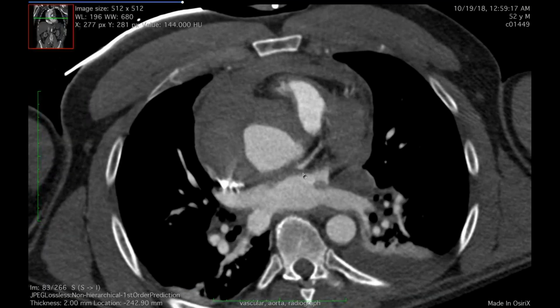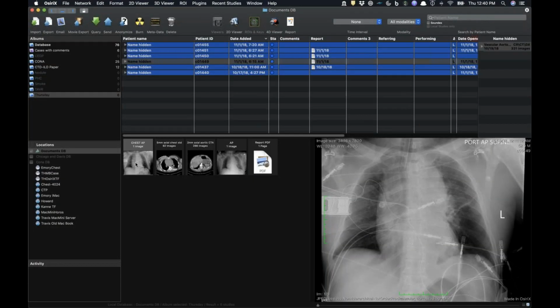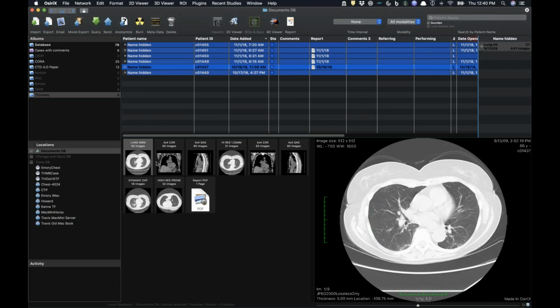They did do an ascending aortic repair, but he never got off the ventilator and unfortunately passed away. But I think it's a really good example of mediastinal hematoma and true widening of the mediastinum, not just a large patient. Because again, you lose all of your left-sided mediastinal structures and all the interfaces, and then the displacement of the trachea. Yeah, very much so.